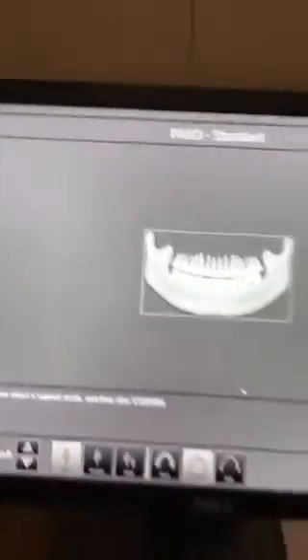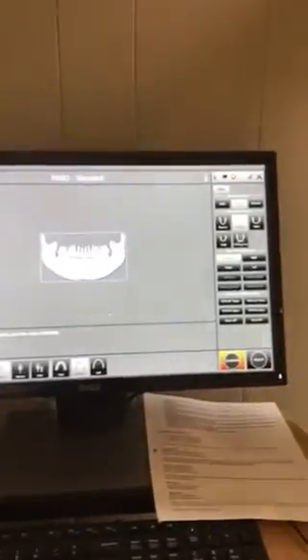It's going to bring up this little window here, and you choose the device that you want to take an image of. In this case, we are taking a pan, which is Vautech. Now, if you had other devices, you could go here and pick what device you wanted to bring an image from. But in this case, we're doing capture device. It's already set to Vautech. So you come right here and you click capture, and it's going to open up the Vautech software that's been trained into here. And this is what this Vautech software looks like.